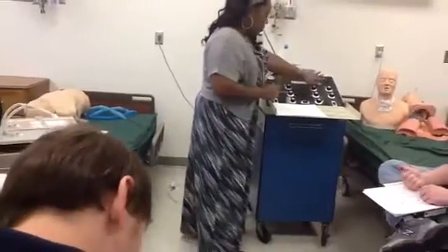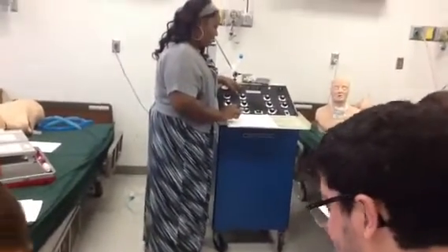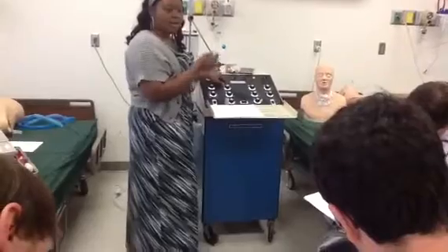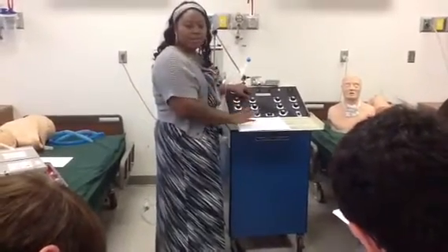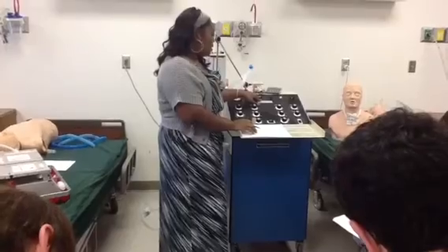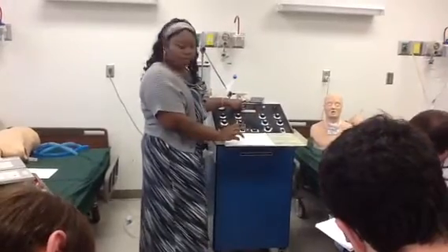Then across the top are your alarms and buttons. So O would be your assist light. It will come on when the patient has triggered a breath. So it lets you know your patient's triggered a breath and that's one of their breaths. It's not just a normal timed machine breath. P is your pressure alarm light. It goes off when either the normal pressure limit has been reached or the sigh pressure limit has been reached.